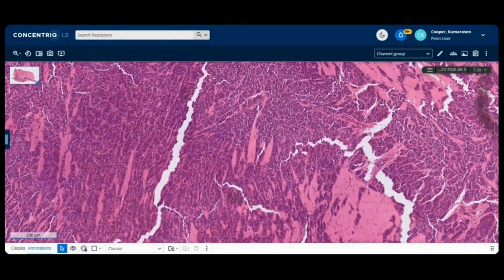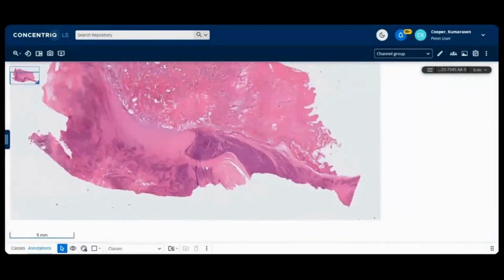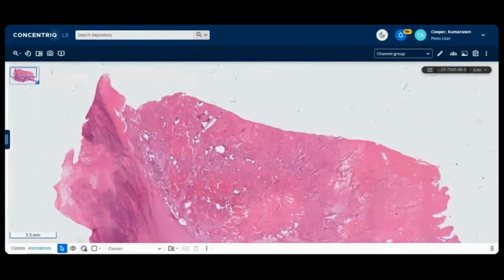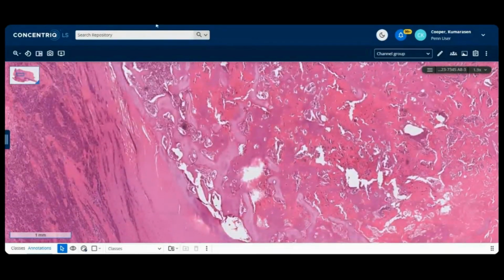So Andy, was there an epidermal component? No, this is all soft tissue, I'm afraid. There was no epidermal component. Let's go back to low power. It involved the foot, but there was no epidermal component for that definition, if you're thinking about adnexal tumors as well. So melanocytic index, chase EWSR1 for clear cell sarcoma.